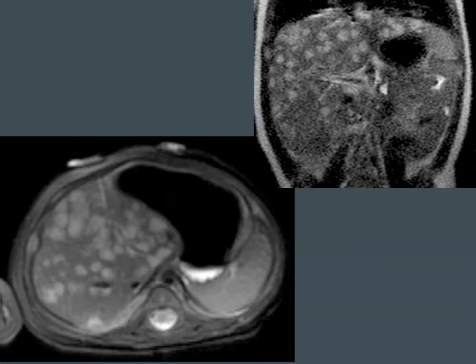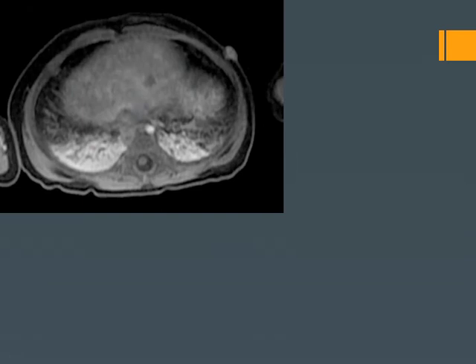Here, the infant that we present at the beginning of this talk has multiple small, well-circumscribed lesions, bright on FSE T2 and single-shot T2 imaging. These lesions filled centripetally. Here, the post-gadolinium T1 sequence. Notice one of the cutaneous lesions here.